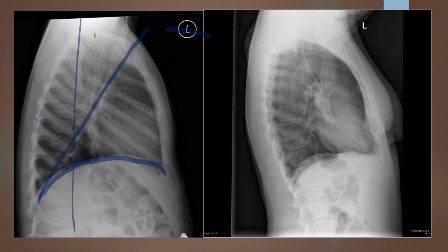We could have maybe moved our image receptor up slightly and collimated a little bit more, but otherwise a pretty nice image. So that one I would certainly approve. It's right on the border. If it had a good marker on it and a little more collimation, this one would be optimal to me, but because it's missing those 2 little components, I would put this into acceptable. I'll let you do the second one here by yourself, and I'll catch you on the next slide.